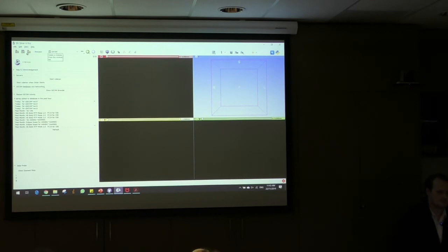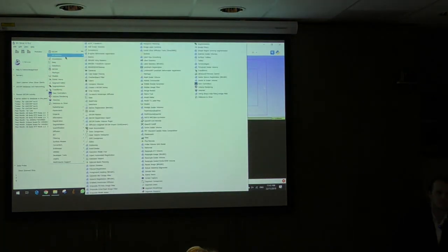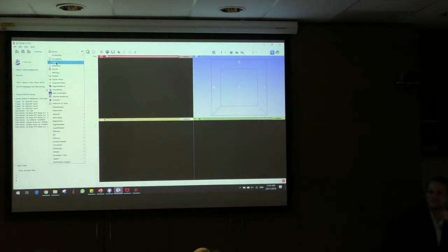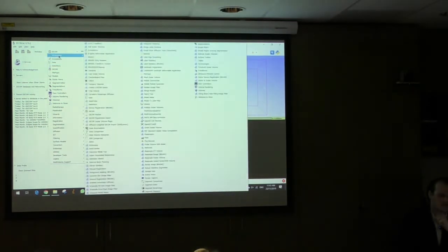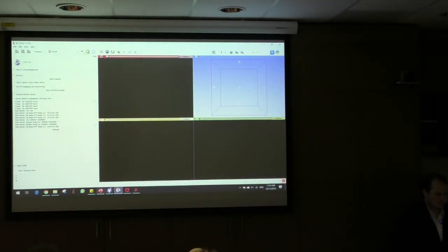We've also got a save function, and then from here we've got modules. Before, I was talking to you guys about that RT extension function. This is actually where it comes up in radiotherapy down here. The other types of modules that you have available are all here, but this is actually the largest variety of different tools that you have with Slicer. Some of these I will go through today, but it's quite extensive. You can start to see how much information there is here.